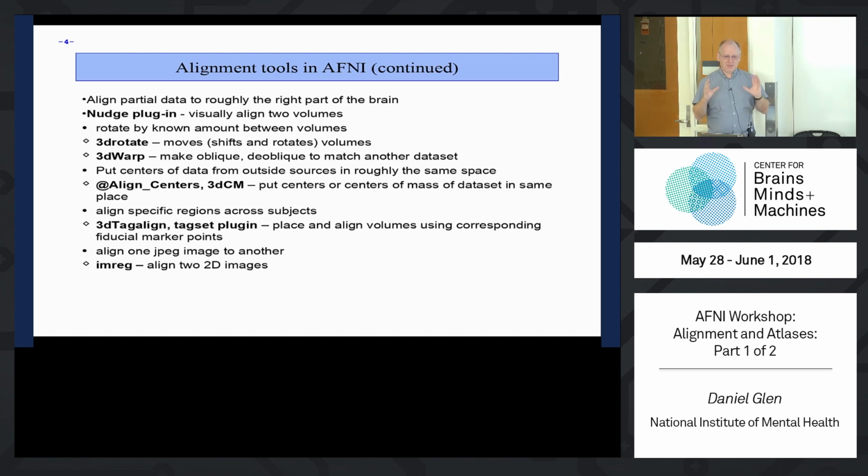The computer has infinite patience and will try every possibility, but we don't. Finding just the right combinations of rotations and translations is really hard for us. So it's good for getting a rough approximation, but it's not good for actually great alignment.